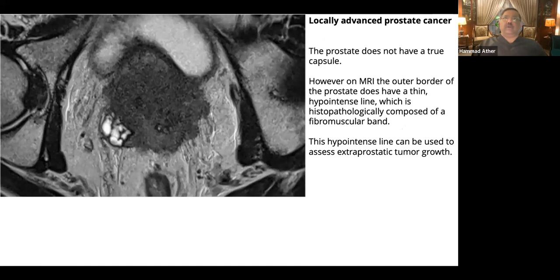Yes, Dr. Amar. Right. So we are moving forward now, and as you can see, this is another selected image. This is the bladder here, the prostate, and I think what you see now, which you have not seen in the previous lesions, is the irregular shape of the whole gland. So Basit, where is the capsular breach, and why is it a locally advanced disease?